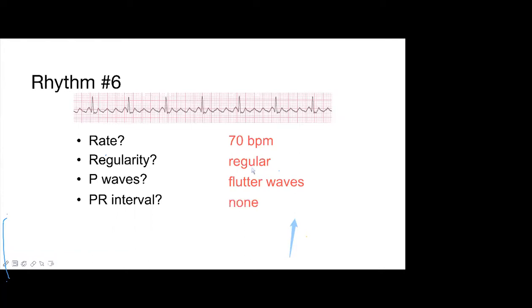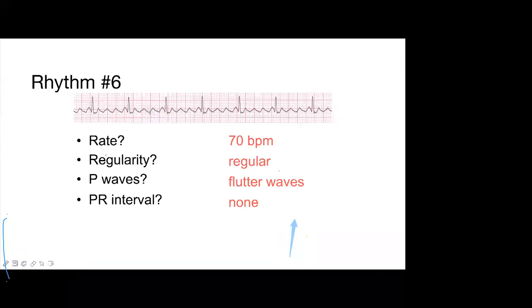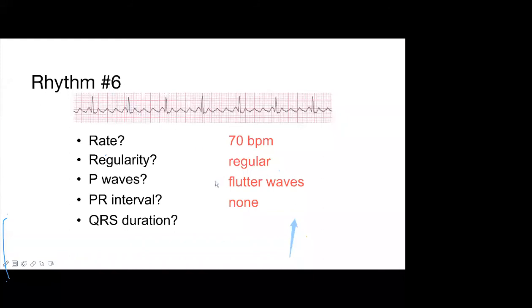There's a PR interval. Okay, so we don't see any because between here and here there's no R wave. So some waves do not have an R wave, and it's difficult to say a PR. This would be like a PP, and because of that you cannot calculate the PR interval. That's the reason. Those that have one, obviously you have that one here, but it cannot represent all of the ECGs.